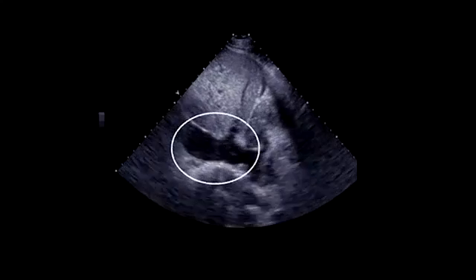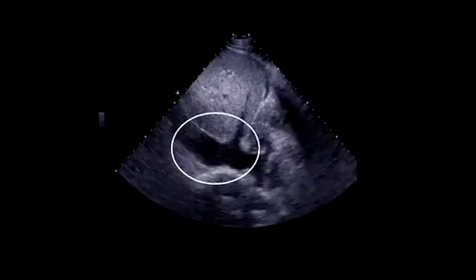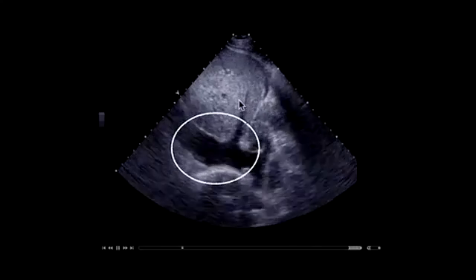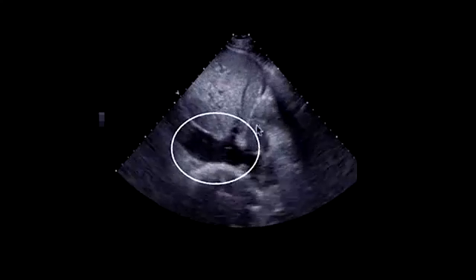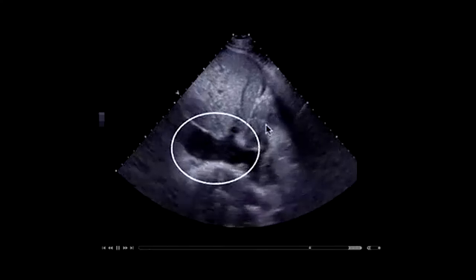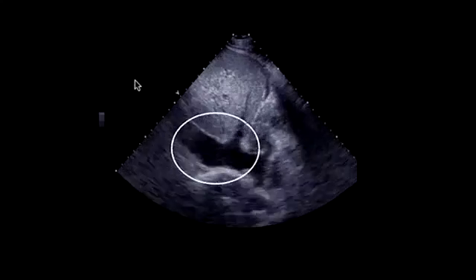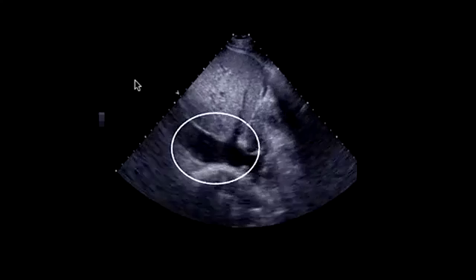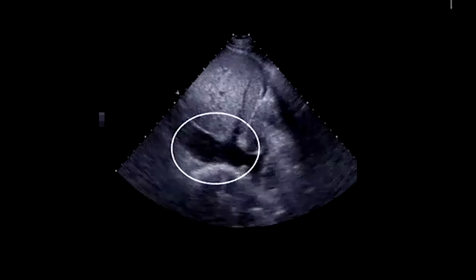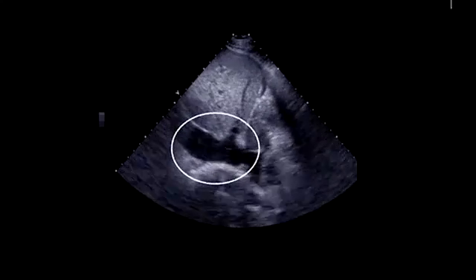And this is how the inferior vena cava looks if there is tamponade. A patient who had myocardial rupture with intrapericardial hematoma. You can see the hematoma right here. The vena cava is significantly dilated and the diameter does not change at all. Normally, you would get a decrease in the diameter during inspiration. This concludes the topic on pericardial effusion. We're almost done. 3 more to go.